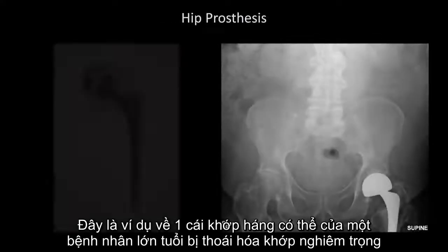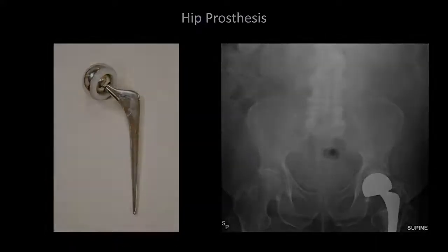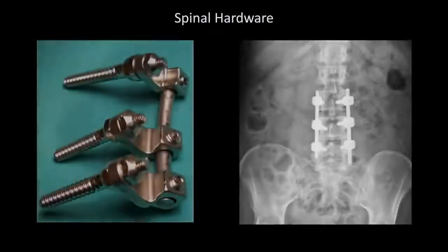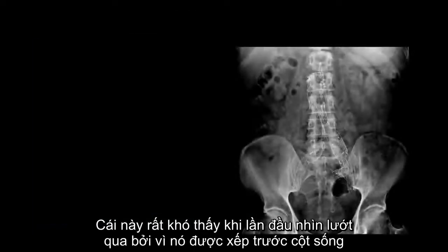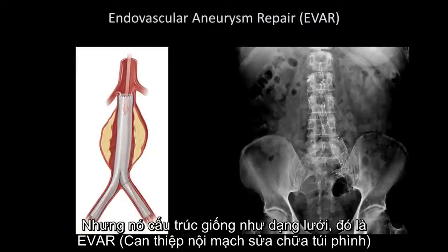The final category of abnormalities are foreign bodies. Here's an example of a hip prosthesis, likely in an older patient who had severe osteoarthritis. You can see a variety of hardware related to spinal surgery. This is a fusion within the lumbar spine. This finding is a little more subtle at first glance because it's lined up in front of the vertebral column, but that fine net-like structure is an endovascular repair of an aortic aneurysm.